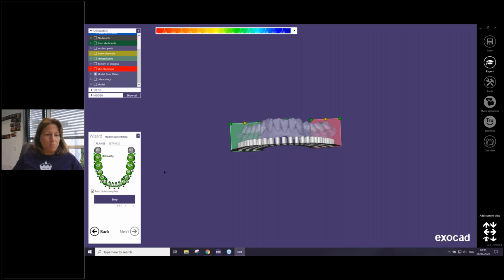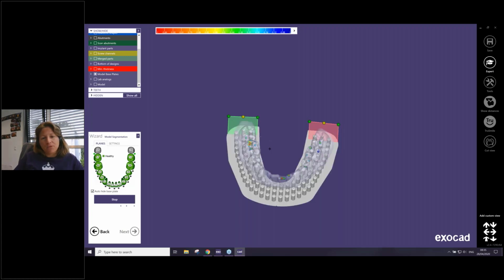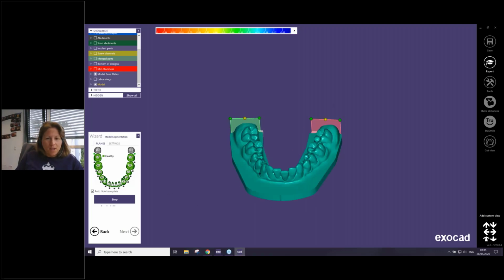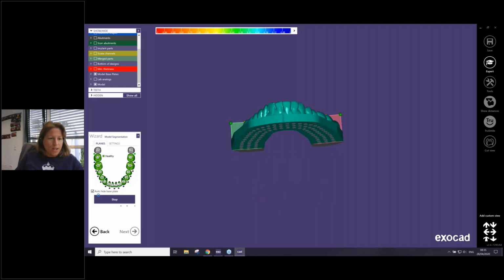Yeah, that's for the model creator. The calculation takes a little bit of time. Normally, if you have a really strong computer, it's extremely fast, but maybe with a laptop a little bit slower. But it's okay. So okay, we can continue then.